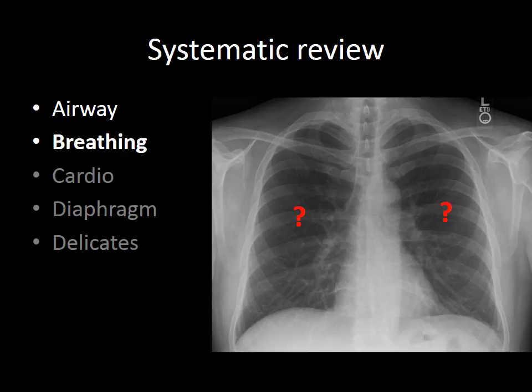The hilar should be looked at carefully because they are commonly forgotten. Remember that the left hilum should never be lower than the right, except in dextrocardia, and both hilar should be of the same density. Look around the edges of the lung fields, assessing for pneumothoraces.